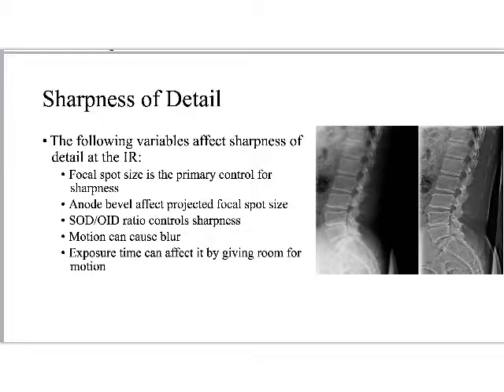So if we said that these two pictures here had essentially the same technique, which honestly they don't, but if they did, which one would have the smaller focal spot size? The one on the right would have the smaller focal spot size. It has more sharpness on it.